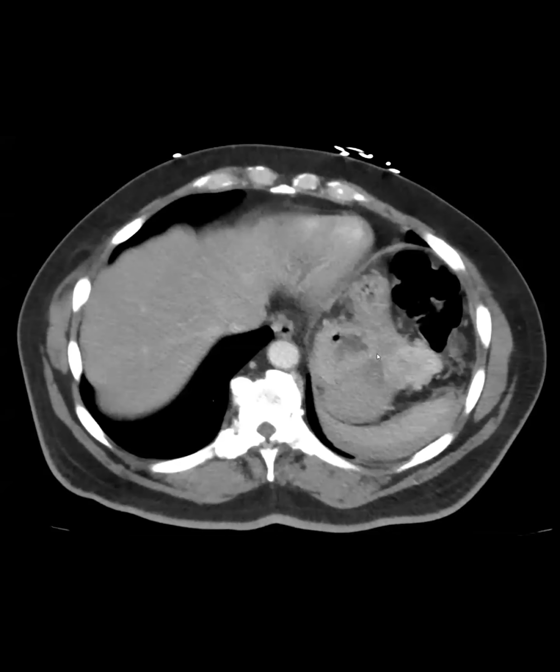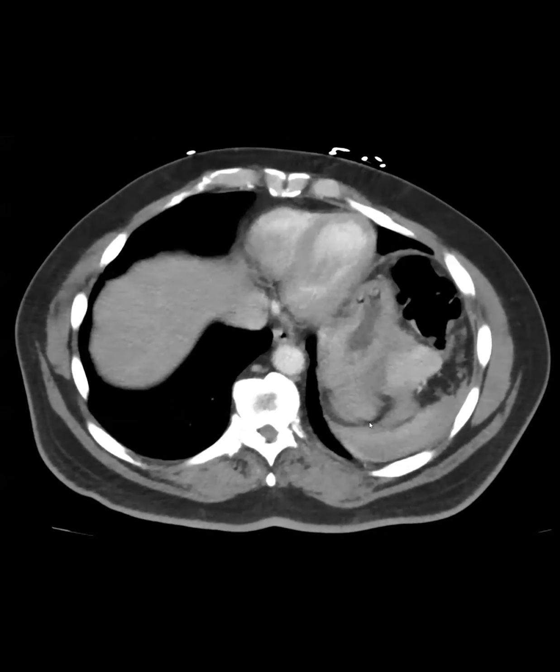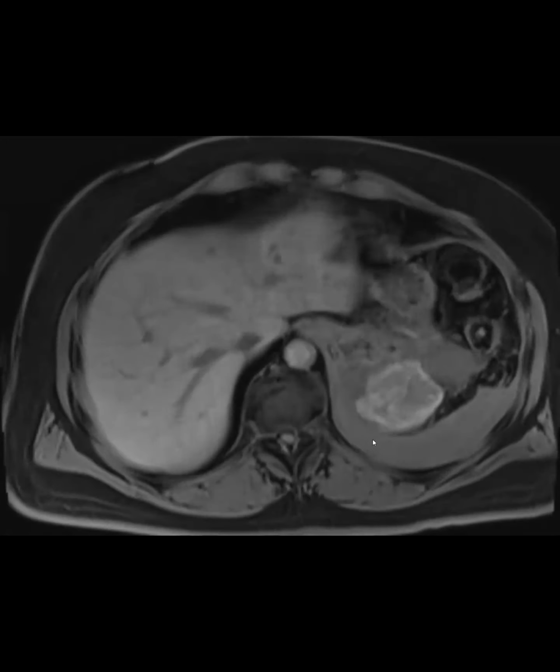Is it a GIST with the tiniest little stalk here? Have you ever seen a GIST look like that, so exophytic? But they can be exophytic though. They can definitely be exophytic. Okay, so I'm going to show you the MR. So it looks like blood. It looks like a mass. Let's get an MR. So, okay, this is the pre-contrast.